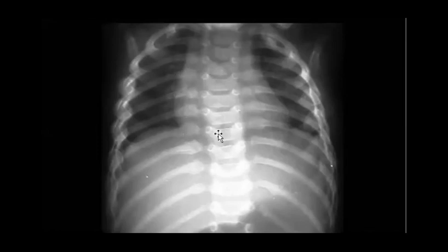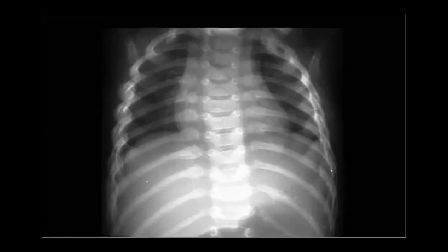It is near the costovertebral junction, and you can expect it from the mechanism of fracture, right? Maybe if you are lucky, you can see more fracture edges, one with periosteum, one without, one with callus. So this means that this patient underwent many fractures, right?